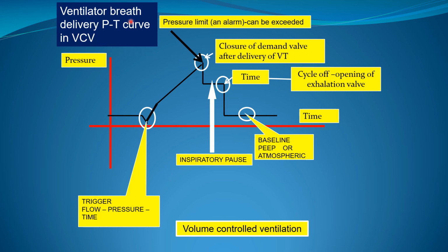This is the ventilator breath delivery pressure time curve in volume controlled ventilation. You start here. This is the triggering, and this is the peak inspiratory pressure. This is the inspiratory pause, which is set by the operator, and this gives you the plateau pressure, and here the PEEP.